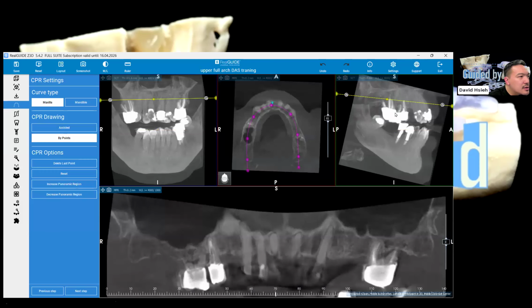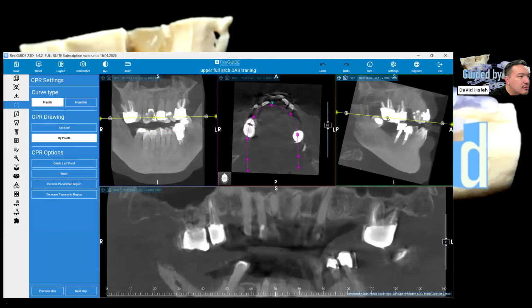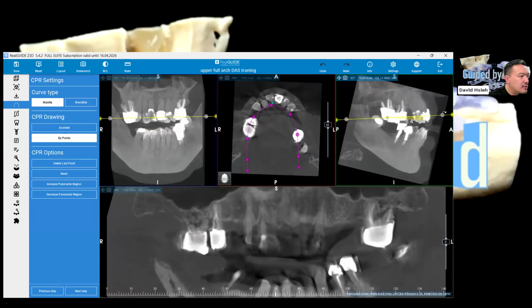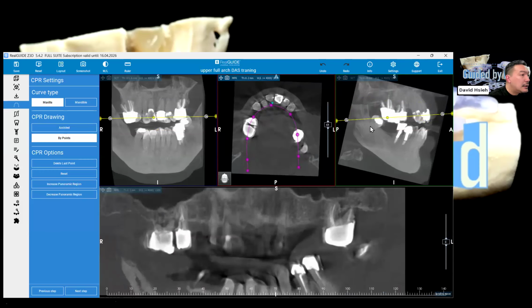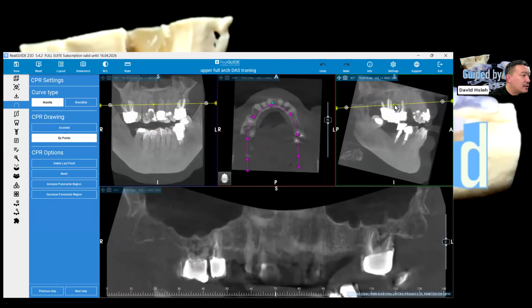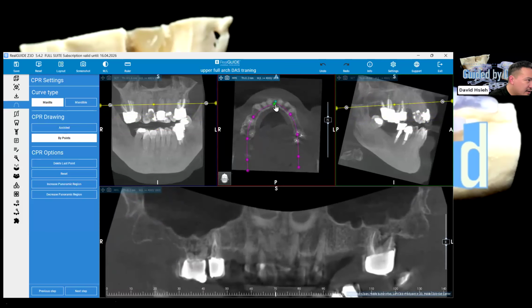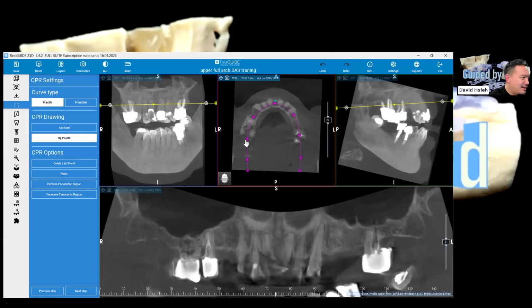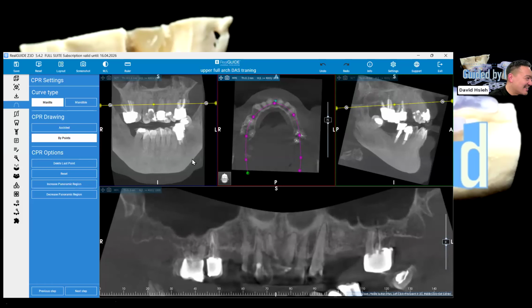All right, so as you can see here, we're pretty close, I would say. So what I would do is change this angle a little bit, and then let's see if the panel curve has followed the bone. No, not really, right? So we still have to adjust a little bit. So the AI is not that smart. Yeah, I mean, I don't know if that's a good sign.